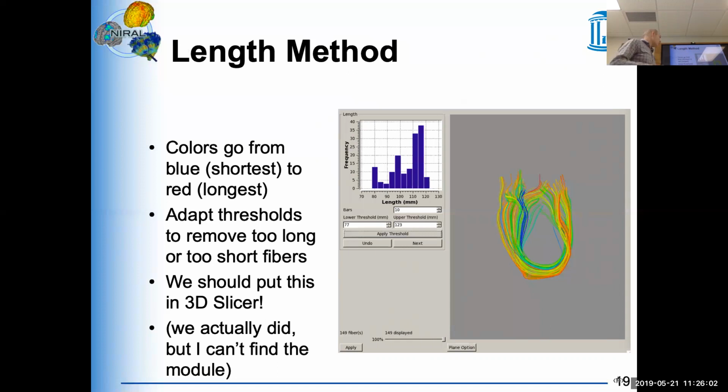One thing that you are prone to get if your tractography parameters are more optimistic is tracts that kind of fold on top of each other. You'll see tracts that go all the way to the end and basically fold and come back. You really want to make sure to get rid of those. That you can easily do by just reducing the upper threshold.